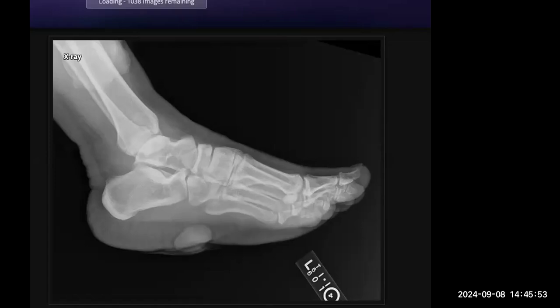In the corners, in the distal leg, I'm able to see some soft tissue density. Do you think they are of a very similar density compared to the lesion on the dorsum of the foot? Yes. So now we are seeing two lesions. What do you think, apart from infection, is something else that you should be suspecting?